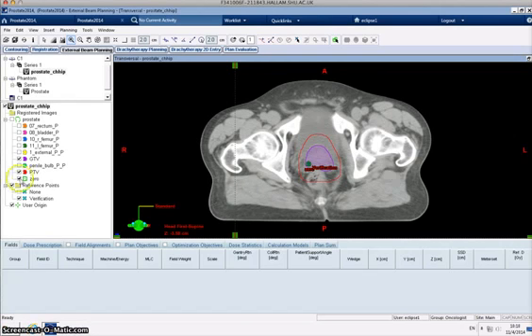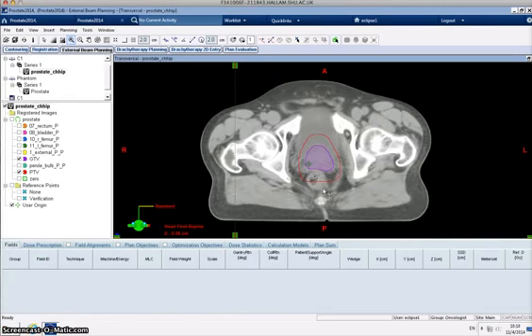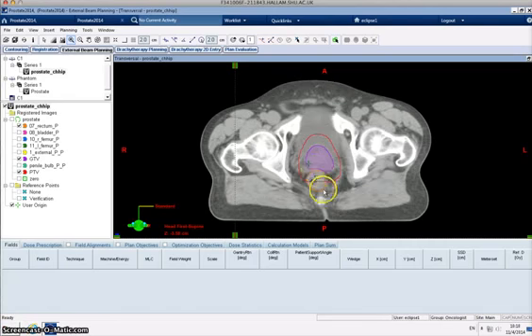and then let me just turn off those points as well so we can see a bit clearer. And then we've added a margin of 1 centimetre in all directions, other than the post border, and the post border is 0.8 centimetres, so a little bit less. But if we were to turn the rectum on, we can see that the rectum is actually going up into the prostate, into the PTV, should I say. So we are going to deliver some dose to the prostate, to the rectum.